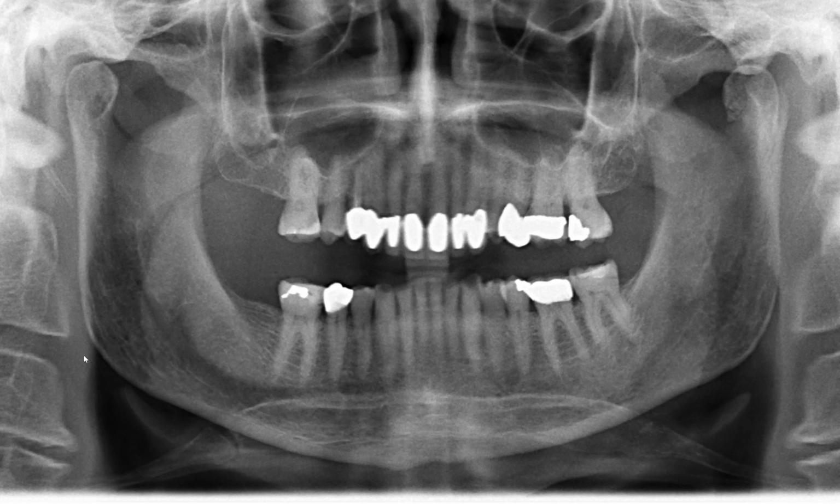Although we don't have a ruler to measure the precise height of the mandible, something that's relatively obvious is the position of the condyle. In this case, on the right side where the patient is asymptomatic, it appears to be well seated in the glenoid fossa, or slightly below and inferior and posterior to the crest or tip of the articular eminence.